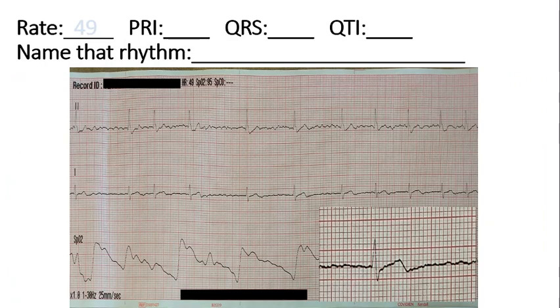Next, this EKG is also looking a little irregular. Rate of 49 is what the computer calculates it at. So look at lead 2, that's the top lead there on the page, and look for P waves, and you don't really see any P waves. And actually, this looks a little sawtooth-like. Sawtooth is pretty indicative of atrial flutter, and it has to be a certain rate, but when you hear about sawtooth waves, and if you go further into the study of EKGs, you'll understand what the sawtooth means. It's a little bit different from atrial fibrillation, like a cousin of atrial fibrillation.